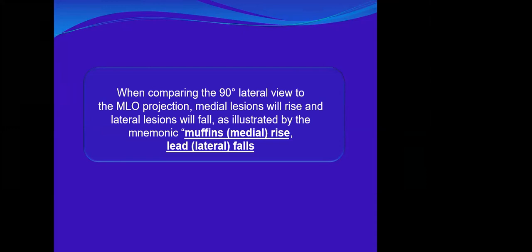And what do you think if the lesion is central? If the lesion is medial, it will rise, and if the lesion is lateral, it will fall or sink. Because the lead is heavy. A central lesion will not change its position.